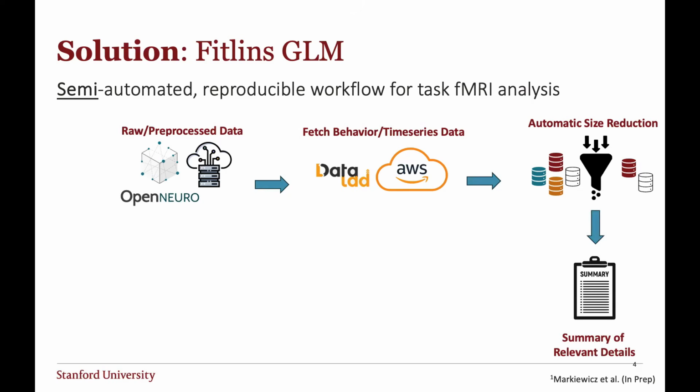And then when you get this data, obviously you can go on OpenNeuro, click through, and look at everything. You can open files when they land on your machine. But sometimes it's helpful just to get a quick summary of the data, the behavioral tests, and the events files, so I can get more into what I need to think about. Is there onset, duration, and trial type? If there's a trial type, what kind of values are in there? And what data types are these? Are they numerical? Are they objects? Or are they some other type like integers, floats, etc.? So you can consider how you need to plan for the next steps.